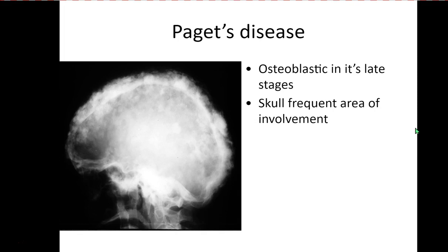So in Paget's disease, we have bony destruction followed by bony repair. You remember that? We've talked about this with other body parts. Paget's disease can involve many sites throughout the body, and radiographically, first you see areas of lucency. Remember that osteolytic or destructive bone lesion. And then when the body tries to repair itself, you'll see osteoblastic growth, or this cotton wool appearance. So the body is trying to repair itself, but then the lesions add density to the bone.